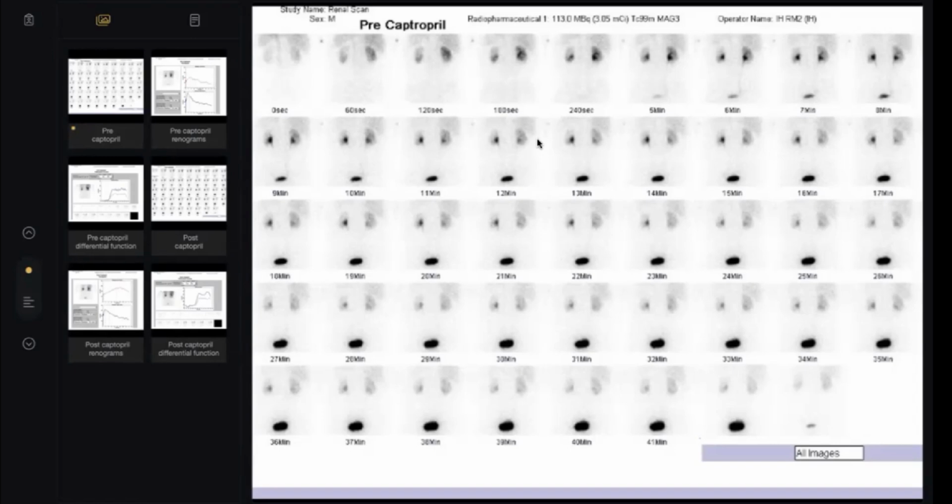Very clear like this. Doctor, can DMSA be used as a dynamic study or not? I think no. Excellent. Why? Because it is not excreted by the kidney tubules. The DMSA, my colleague, the other tracer, is just taken up by the renal cortex only and not excreted by the kidney at all. So DMSA is not used as a dynamic study. DMSA is not used to measure the renal function. Okay, this is just startup information.